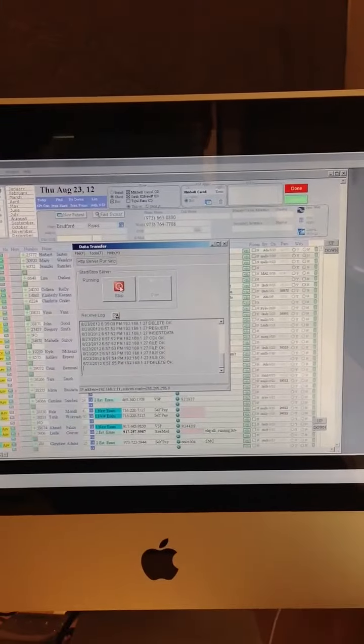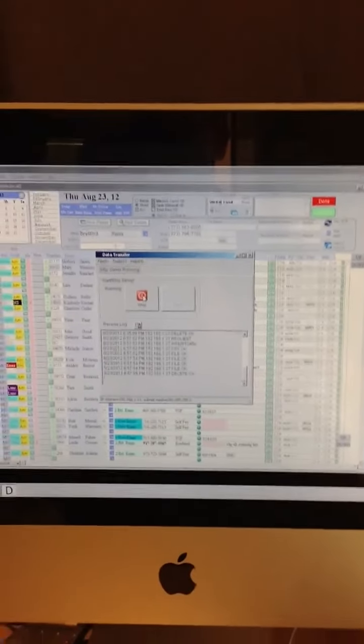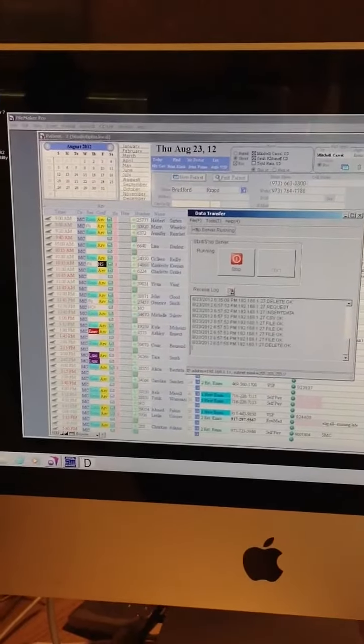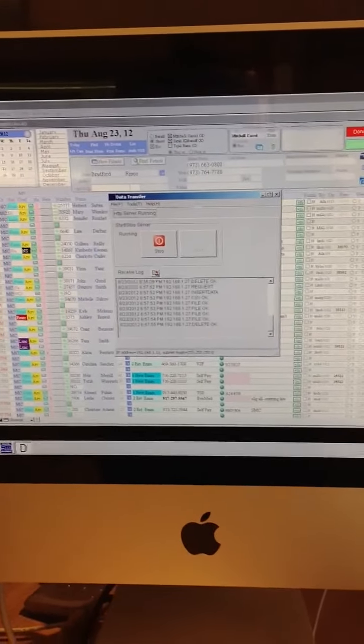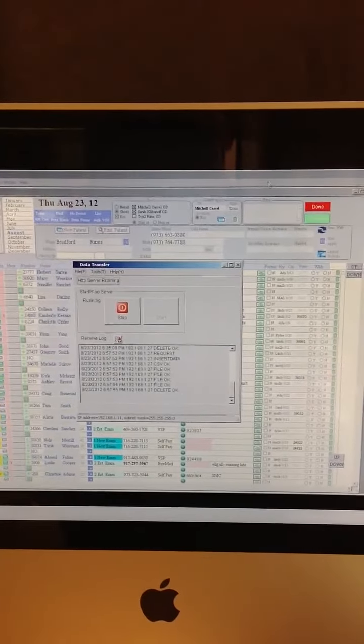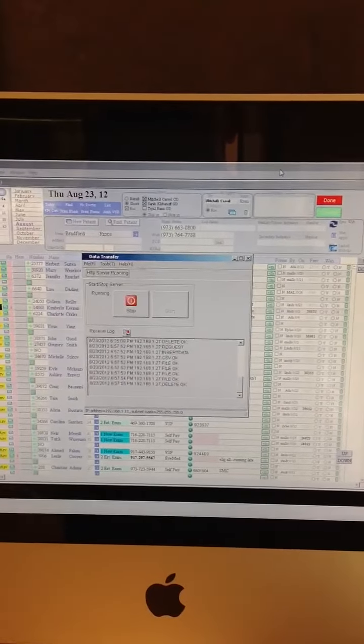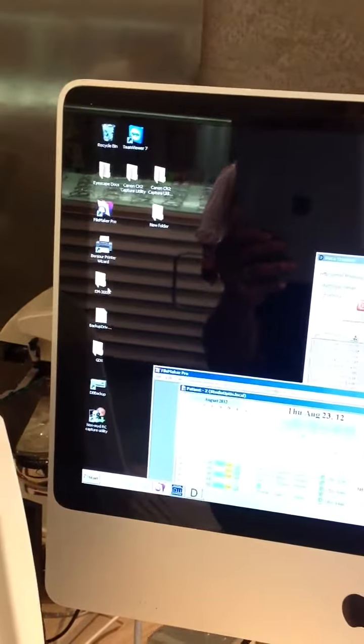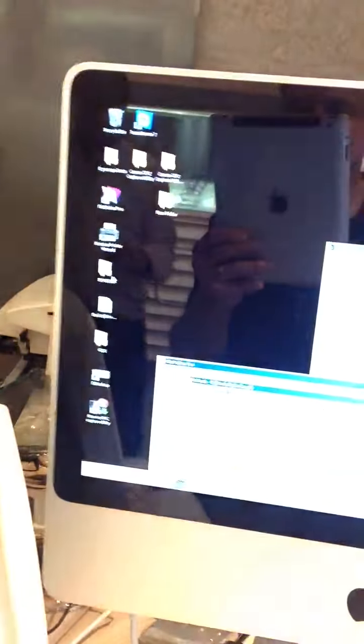Now we're going to go back over to the screen, and if you catch it, you'll see it's actually loading files. Once it's done, you can go over and minimize the screen a little bit here. Trying to do this through the camera. So we'll drop it down, and you'll see there's a folder on the screen that says EM3000. That's the same as the device name, EM3000, and there's EM3000 right there.